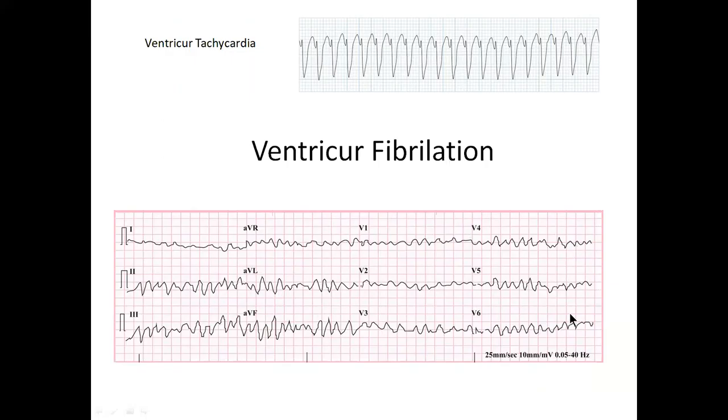Now, let's look at this ECG. What is the first thing you notice? Now, remember our sequence. First, we have to try to figure out the rate. You cannot see any proper QRS anywhere. It's like a little child came and just drew a line and you cannot see anything, right? So this is ventricular fibrillation, as opposed to ventricular tachycardia, where if you really pause for a second and go through your system, you see that each one is a very regular and wide QRS, as opposed to this mess. This is ventricular fibrillation.